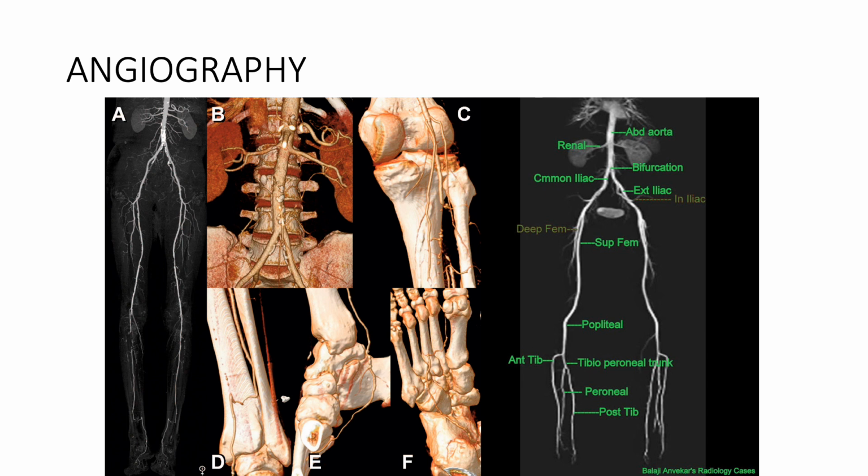So that's already a reconstructed image in CT scan.